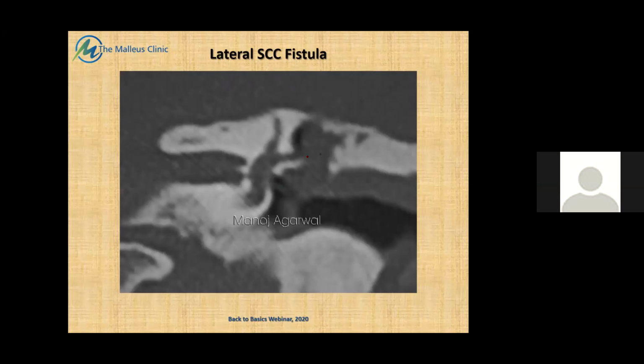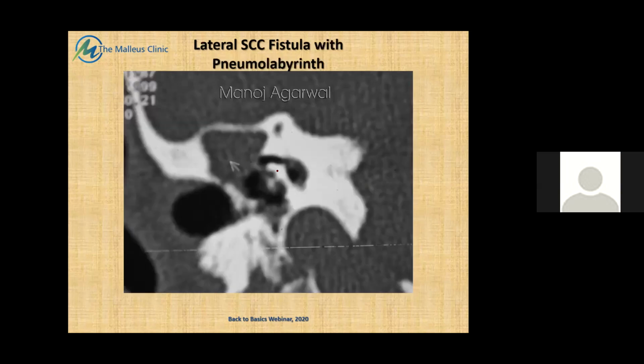That's another case of a similar scenario. There is an isodense shadow here, which is cholesteatoma. You can see the thickening of the external auditory canal wall, but what definitely you see here is that the lateral semicircular canal has a fistulous communication with the mass in the attic or the aditus area. So repeatedly saying, the first thing that you would think of within a patient with chronic suppurative otitis media, complaining of sudden onset vertigo without vomiting, and an increase in the hearing loss, an added sensorineural component to the previously conductive hearing loss, we have to think of a lateral semicircular canal fistula.